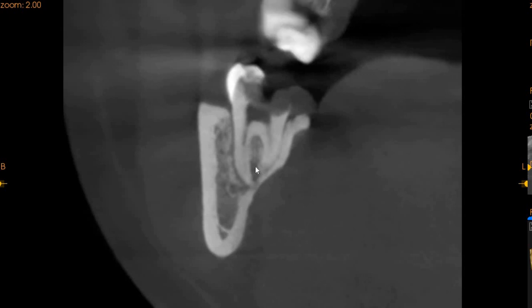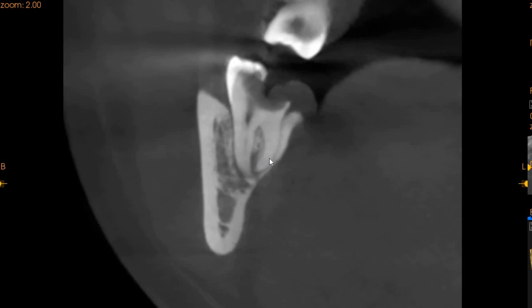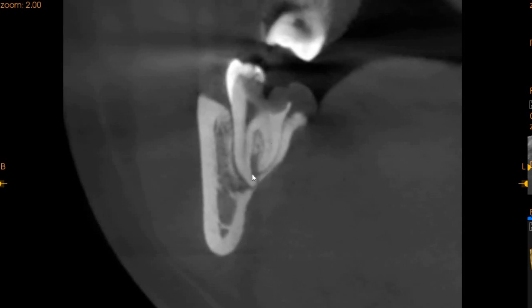And here we can see that the canal compresses, and this is a classical indication that the root is in contact, in very close contact with the ID canal. And then here we can see that the loops, even though not completely looping against it, the buccal root does go right below, and here the inferior alveolar nerve can be seen right in between the two roots.